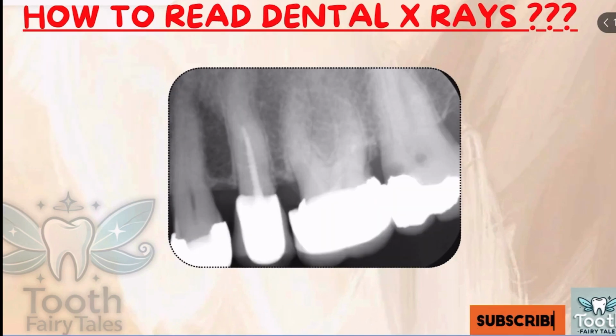I'd like to talk about root canal on this x-ray. As you can see here, this tooth has a white structure here at the nerve canal. This is called root canal filling material, and this is done after root canal treatment is finished. And after root canal treatment, usually the dentist recommends a crown.